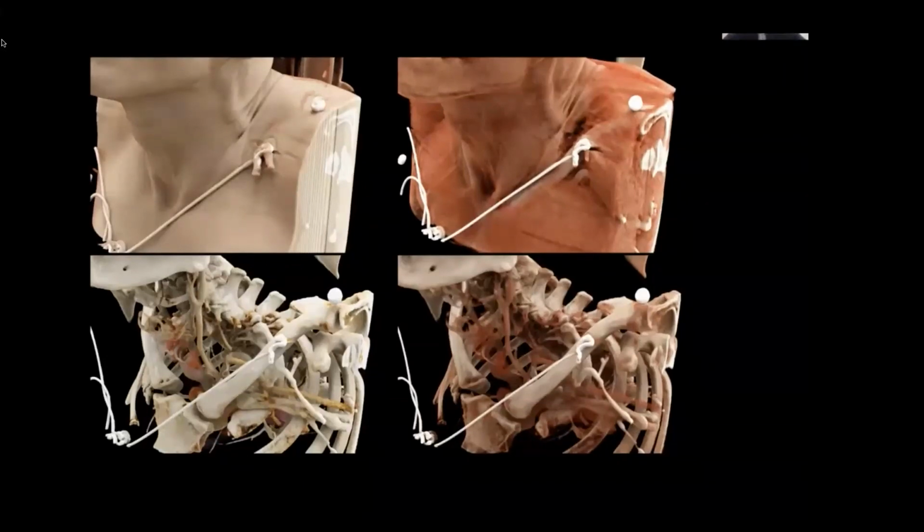which includes considerations of where the light is being directed from, how much of a shot. I don't know if you guys do much photography or film or anything like that, but depending on directionality of light, depending on things like shuttering, depending on a number of parameters, you can actually depict these structures in various ways, which is what allows us to visualize the layers that we see. It also allows us to visualize the different depths and the shadowing of structures on top of one another.